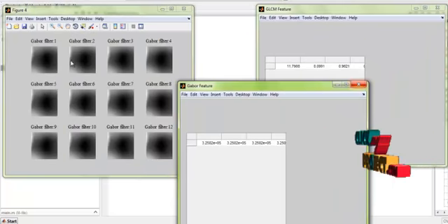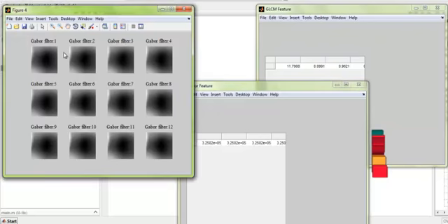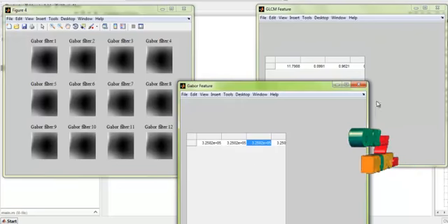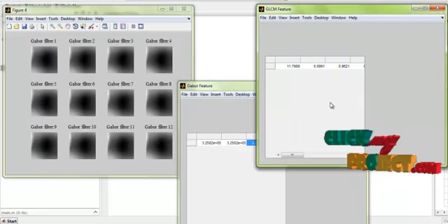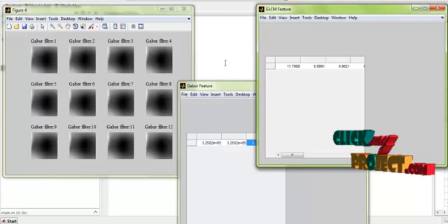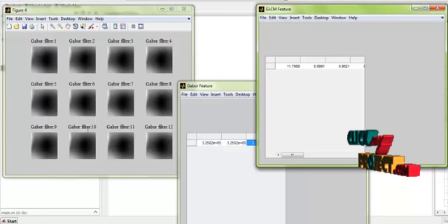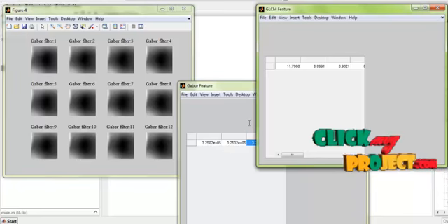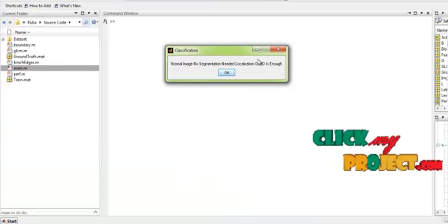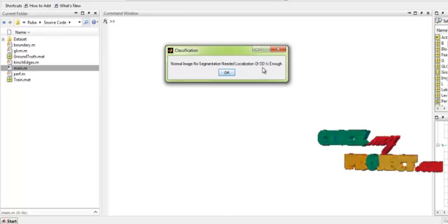Here the first features are extracted based on the Gabor wavelet. The extracted orientation values in each iteration are displayed here, and the values extracted for each orientation are displayed. After that, these are the GLCM features extracted from the images. Basically, 12 GLCM features are extracted from the images. These features depict the texture-based information from the images, and they will be the input for the classification process. The SVM classification is done, and it classifies the input image as a normal image. So for a normal image, no segmentation is needed, localization of the OD is enough. This message is displayed.